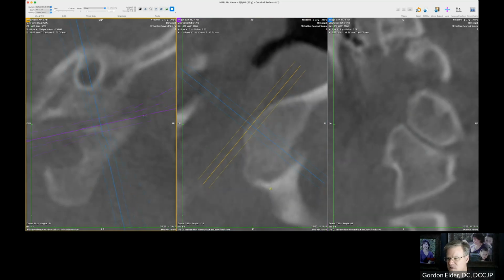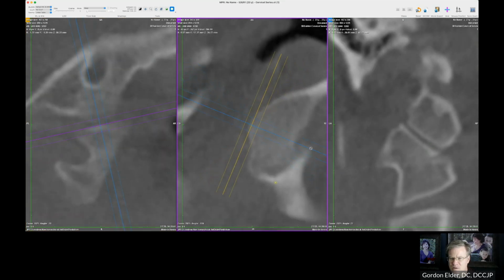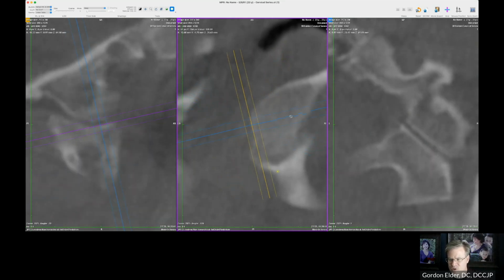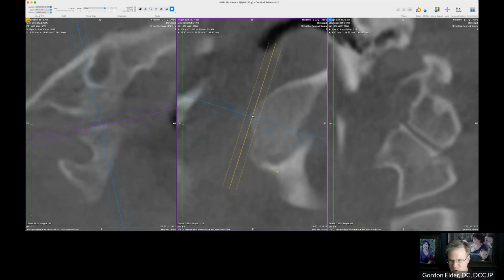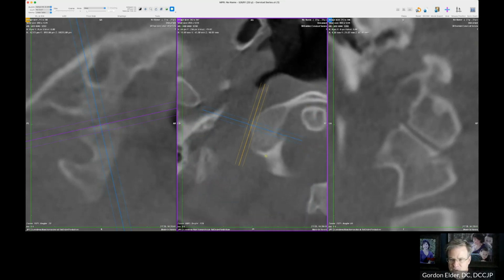We can move this. So we're starting to lose that overlap, so that we're starting to go too far forward and see things that probably aren't accurate. But that's pretty good. Now, if we start coming back here, where the joints just are not mirror images, we're going to start getting all kinds of interesting different things there. It looks totally lined up. But this is the point that Dr. Blair determined most consistently was going to show an overlap or an underlap when it should be in juxtaposition or even.